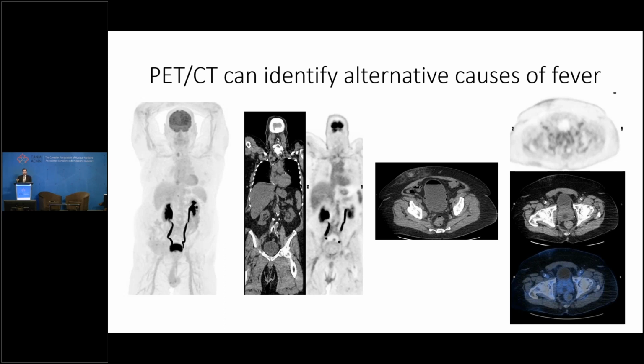However, if you notice on the MIP images on the left, the kidneys seem not to be functioning so well. There's a lot of stasis in the ureters. The bladder has a half moon crescent shape, not very typical of what we usually see. So we cut through the kidneys on the next two images. We see a bit of hydronephrosis, and there's some non-radioactive urine in the bladder. Why is he stagnating urine? What's happening here? Cross-sectional images is the next image, and we can see that there's air in the urine and there's gas in the bladder wall, emphysematous cystitis.